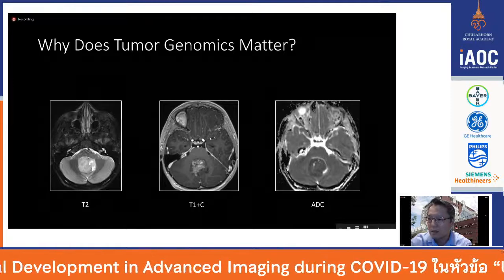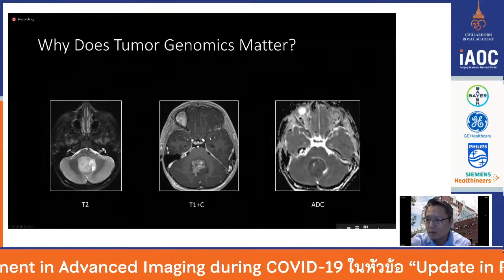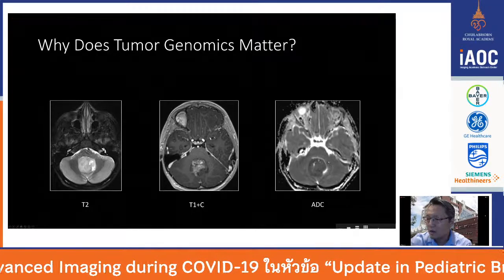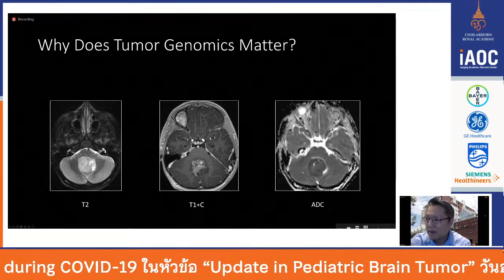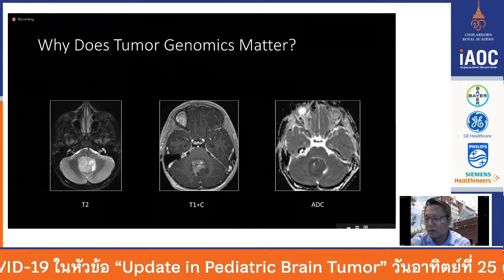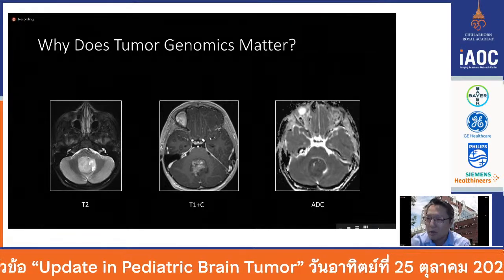So here we can see a T2 weighted image of this midline tumor, and we see that on post-contrast images, it has this heterogeneous enhancement. And on the apparent diffusion coefficient, clearly it's a little darker than the cerebellum. So already we know if this is a child, this is a very classic posterior fossa, fourth ventricular midline tumor, we should be thinking about, in high grade, medulloblastoma.